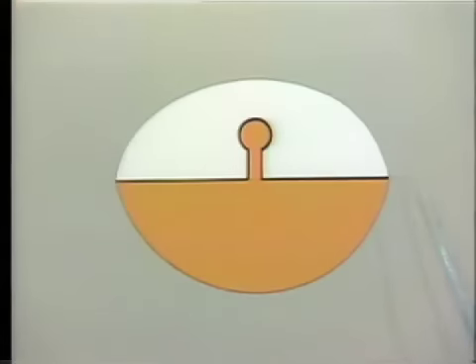The next diagram here shows a view of the cervical end of the pontic, the aspect of it which would fit against the mucosa. This is the porcelain facing, this is the gold backing, and here is the key extending forward and holding the porcelain in position, which has been cemented on, of course. If it's just made without any modification, you get this type of finish. And there is, of course, a cement line across here and around here, the possibility of that washing out and creating crevices in which food plaque could accumulate.